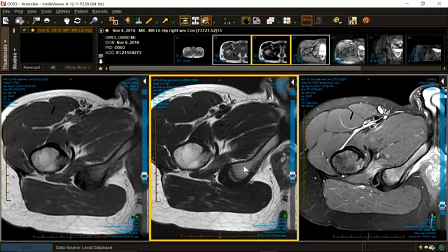So there are two ways you can get that. He could have stretched it and developed an interstitial tear, or while he was stretching, he compressed it, as in ischiofemoral abutment syndrome. So how is that treated? By a physical therapist. And it's going to be the physical therapist's job to figure out whether it was a compressive injury or whether it was a distraction injury. But a beautiful view of the anatomy of the hamstring. Next. So no hamstring tear.